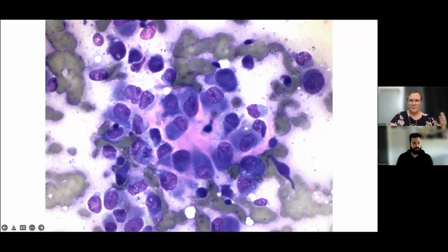Do we think they're epithelial, mesenchymal, or round cell in origin? Now, I know some of them have a little bit of a rounded type appearance, but they're not round cell in origin. A lot of them actually have some projections off of the sides and have a little bit of a wispy look to them. And so also, if we're thinking, oh, this might be a round cell tumor, we have to think about the 5 round cell tumors, recognize that this doesn't look like any of those, so we can eliminate that.